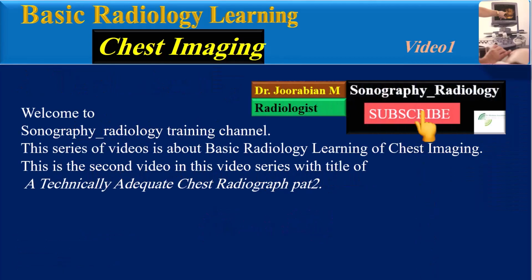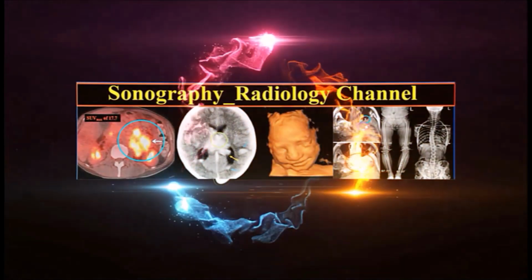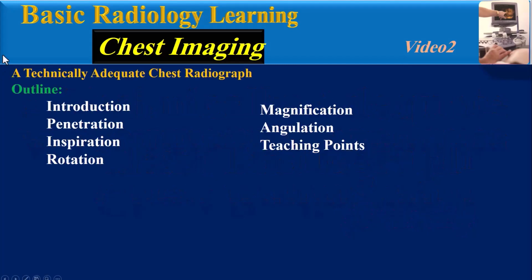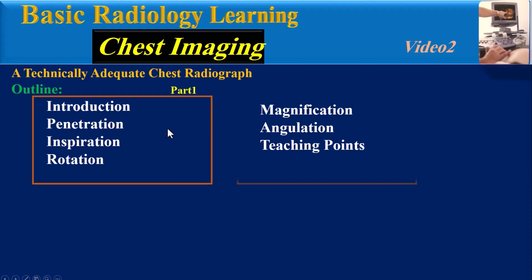This series of videos is about basic radiology learning of chest imaging. This is the second video in this series, titled A Technically Adequate Chest Radiograph Part 2. These items were explained in video part 1. In this video, part 2, I will explain magnification, angulation, and final teaching points.